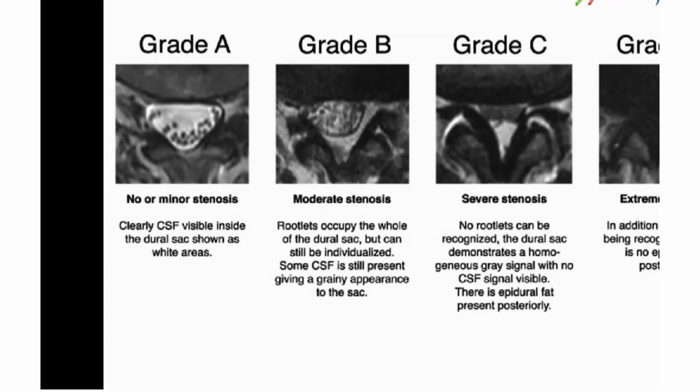And look at this. This is completely critical stenosis. There's hardly any epidural space also. There's no epidural space. So these are the kind of stenosis which require surgical decompression. Because it is not a disc which is compressing. It is the facet joints. It is the ligamentum flavum. From posteriorly, they are compressing the entire thecal sac.